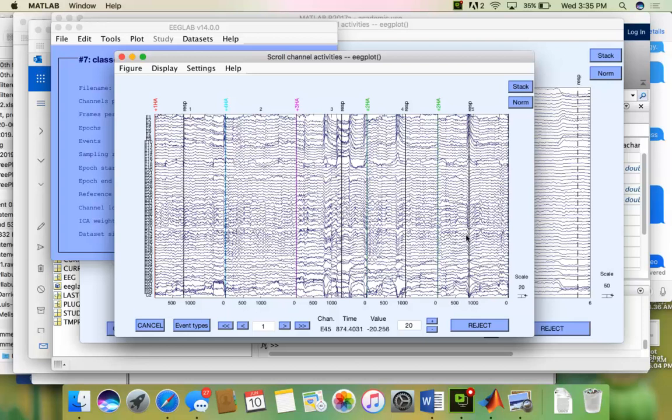Now remember, I took the data before I did ICA. So there are 2 possible approaches. One approach is to take your whole data set before you have done any selection of epochs, or selecting only a certain time period of EEG around the presentation stimulus.